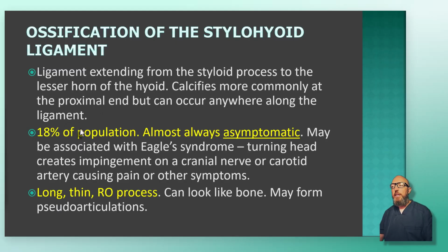You see this is really common, about 1 of 5 people. Almost always this is asymptomatic. Every year I'll get probably a dozen or more questions saying, hey, I think this patient has Eagle syndrome because we see this ossified stylohyoid ligament. Of course, I get a lot more than that if they reported everyone to me, but it's really rare to actually have symptoms from this, but it can happen.